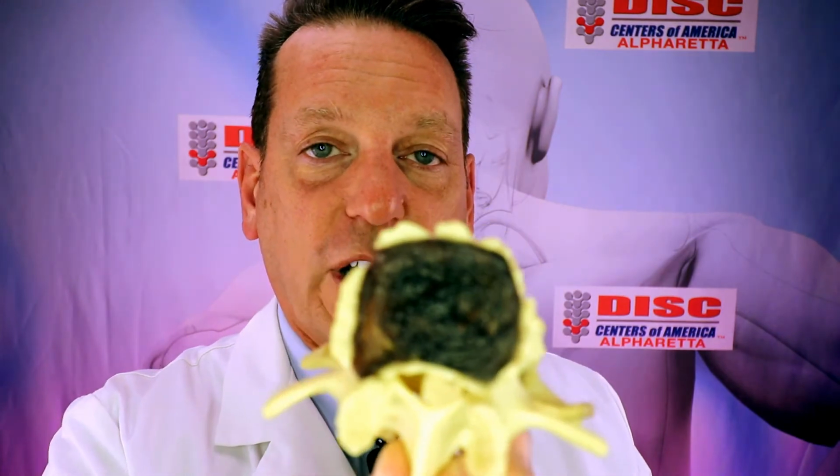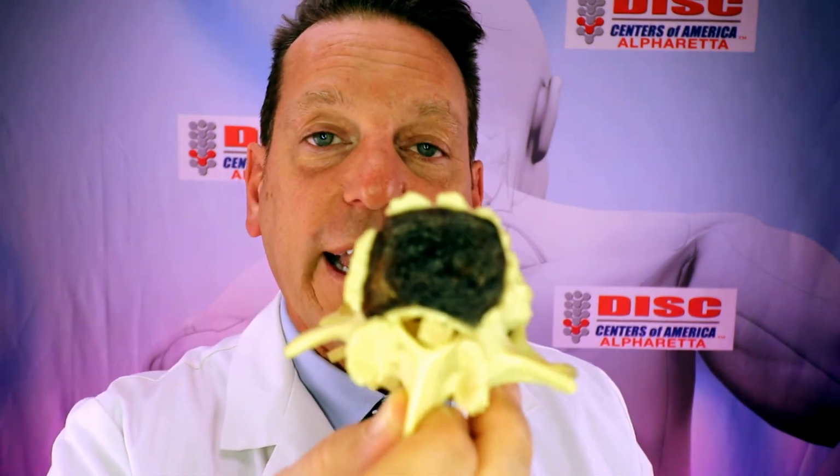If they lose the ability to get blood supply in and out of them, which is called desiccation of the disc, then the discs start to become much darker on an MRI. If you're seeing discs that look very dark to black, that means that disc is not getting blood supply in and out of it, and it's not getting oxygen into the tissues. It's changing its metabolism from an aerobic activity, which means with oxygen, which is how it's supposed to be, to an anaerobic activity, which means metabolism happening with less oxygen or no oxygen. Unfortunately, the process of that produces lactic acid, which means the disc is making its own acid within itself and starting to almost eat itself away from the inside out.